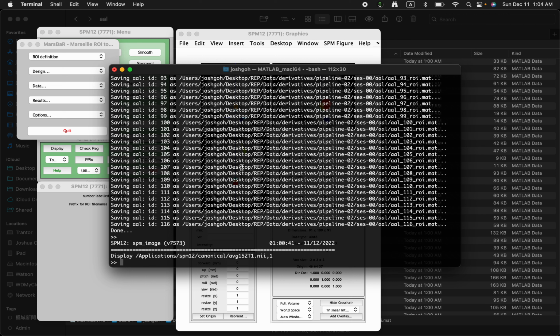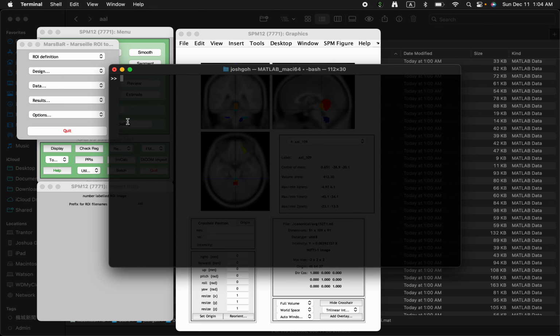Let me just clear the screen here by typing clc. All right, I'm going to type the variable called SO, which is slice overlay. That's what it stands for. You can choose A, B, C, whatever variable name you want. I'm just going to stick with SO here. And I'm going to make that variable equal to a function called slover. Some people might say slover. It's basically slice overlay. That's what it means.